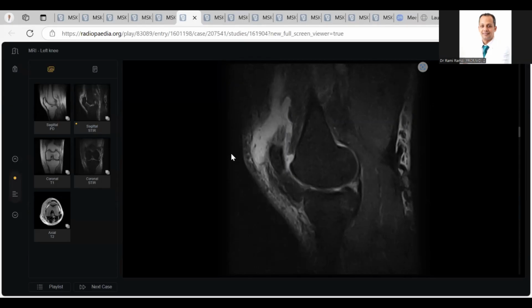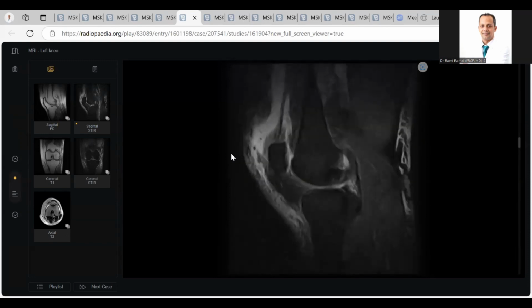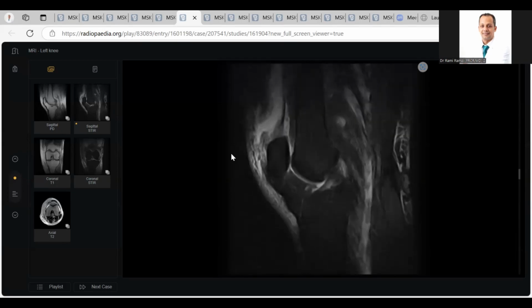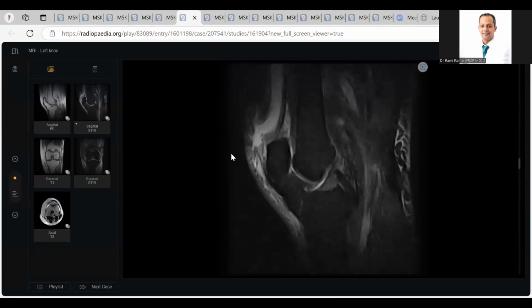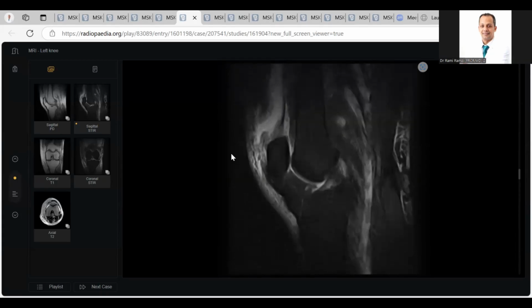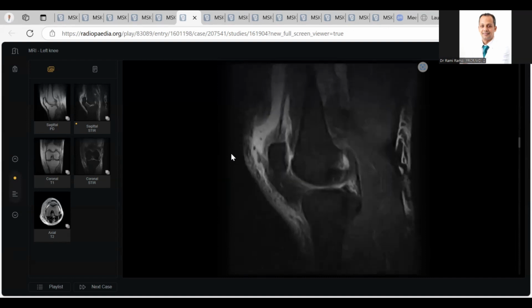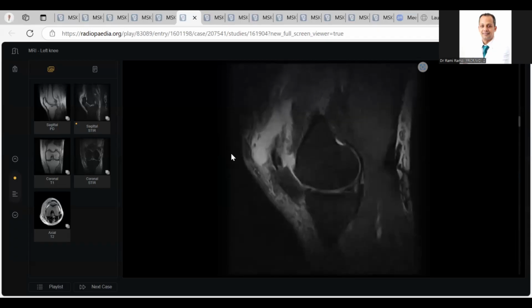You did very well. This case really was a little bit difficult because most of us are looking at the meniscus and the ACL, PCL. However, you picked it up, despite late, but better than nothing. This is a quadriceps rupture in a non-traumatic old patient. You should immediately tell the examiner, I will ask for any history of chronic diseases like diabetes mellitus, chronic renal failure, gout, or connective tissue disorders like systemic lupus erythematosus, rheumatoid arthritis. In addition, long-term corticosteroid intake is a very common associated chronic etiology of spontaneous non-traumatic rupture of the quadriceps tendon.